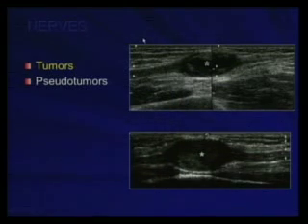We can check for tumors originating in the nerve sheath. As you can see here, when you see an ovoid mass in a neurovascular bundle with an afferent nerve and an efferent nerve, you can say that this is a nerve sheath tumor. These tumors may be solid, or in case if they are Antoni B, they have myxoid material and they can look like a cyst.